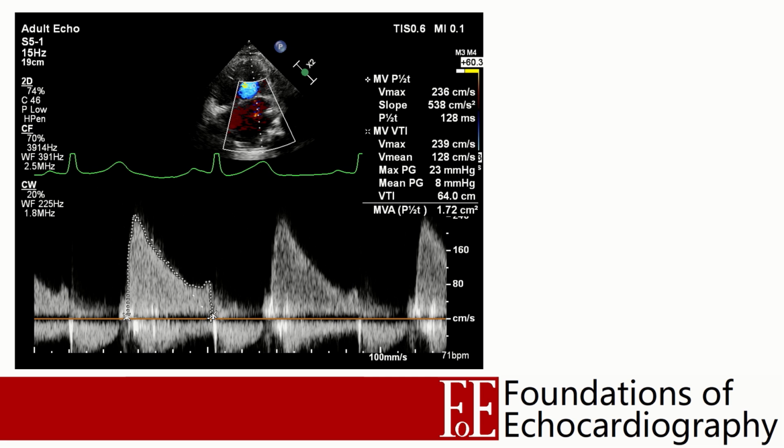When we looked at a previous example of a patient with elevated left atrial pressure, the early filling rapidly terminated as the high pressure forced blood into the LV. But in this patient with mitral stenosis, the blood can't pass through the valve quickly, and so LA emptying is protracted. LA pressure remains high, as does the pressure gradient.